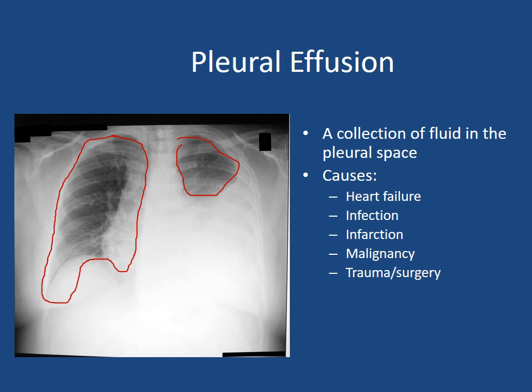One typical characteristic of a pleural effusion is that it tends to have almost like a little triangular shape at the outside edge, almost like a leading edge of fluid as it moves up the chest wall. The technical word for it is a meniscus. So it's essentially this triangular shape on the outer edge of the chest wall where the fluid starts to move up the chest wall.